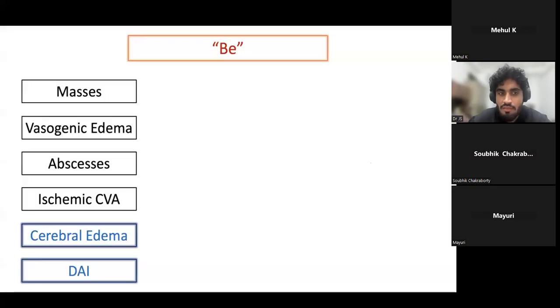Okay, then after that we have the brain. B for brain. Any blood can be very bad. A for airway, or air spaces, mainly nasal and paranasal. Then we have completed the blood part, that is extra-axial and intra-axial. Then we came to blood can be very bad. Okay, so C and V, cisterns and ventricles, we have completed. Then after that, B is the brain.